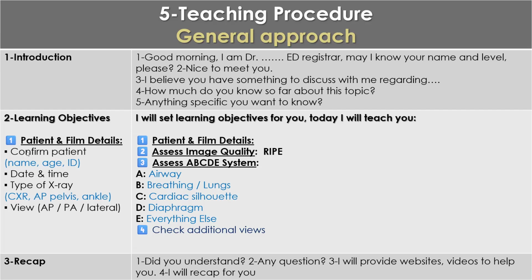First, a chest X-ray must have the patient's details: name, age, and ID. At the same time, it has to have the date and time the X-ray was taken.